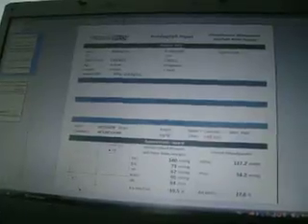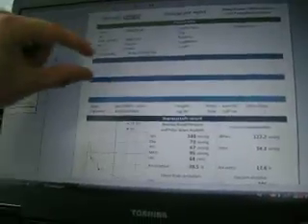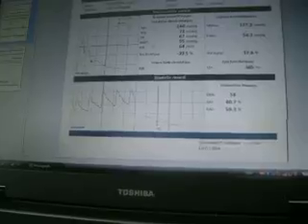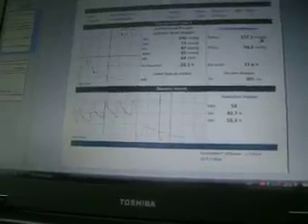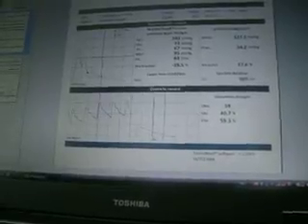Let's see how a printout looks like. Now I selected the printer, and this is the form of the printout. First, patient data, risk profile of medication. If I would enter anything here, that would be listed here, of course. Measurement data, and now on to the results. First of all, suprasystolic records, but these are just the brachial or peripheral blood pressure records. These are the central or aortic blood pressure records. These are the parameters obtained from the diastolic phase.